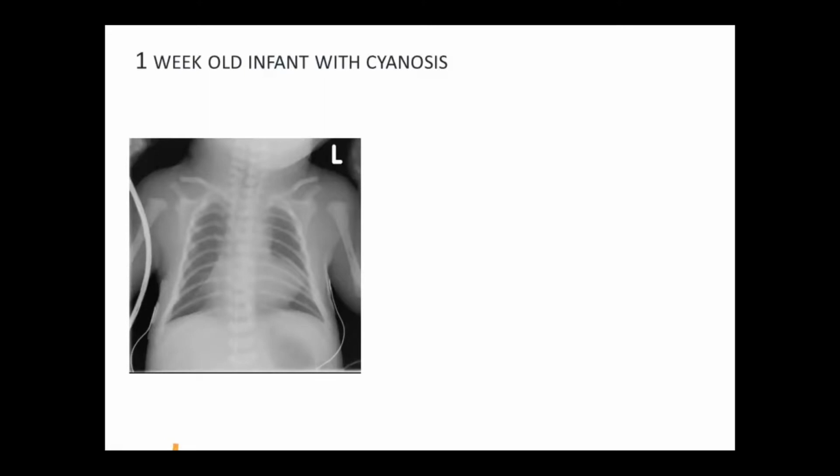The next patient is urgent. A week-old infant with worsening cyanosis. A stat X-ray is ordered for him. You quickly ascertain that the chest is adequate by checking penetration, inspiration, and rotation, all of which are normal in this film. The thymus is not present and there are no abnormal masses present in the film. The heart seems a little bit larger than 60% of the mediastinum's diameter, but more importantly, you notice that the shape of the heart looks a little bit off. What is your working diagnosis at this point?